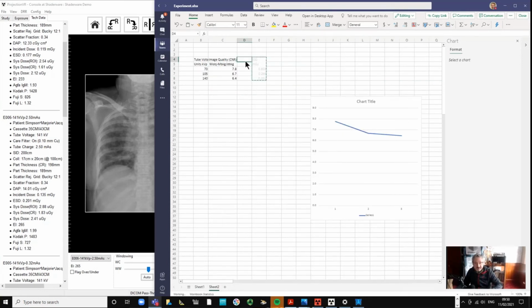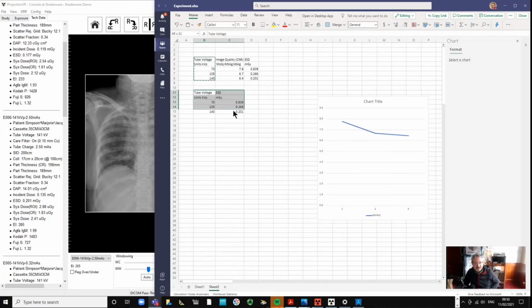That's my excuse anyway of why I'm doing this badly. So now we do, in fact, it's a lot easier just to copy that down. Okay, so now you've actually got your tables. These are your two tables that you would put in your column.